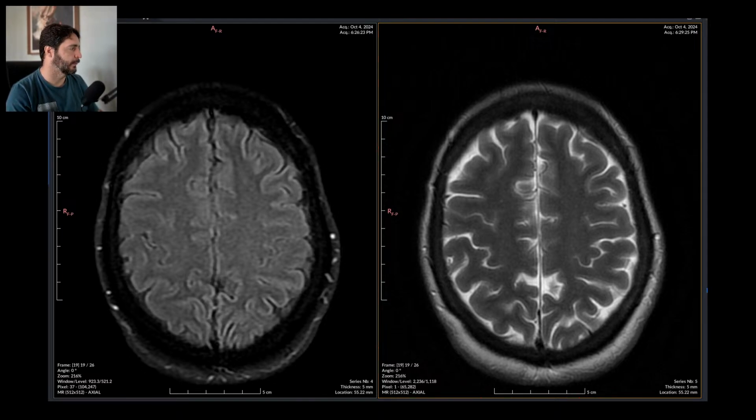And I'm just going to read another scan, and we are going to end this stream because I have to pick up my kids from English school, and they get out at 10 and it's already 9:41.